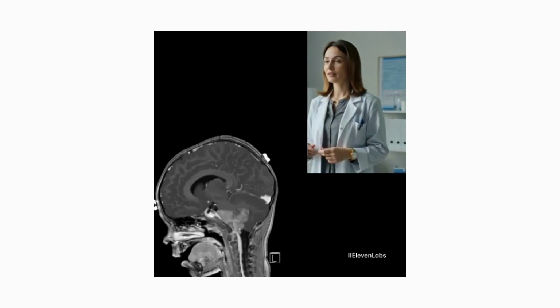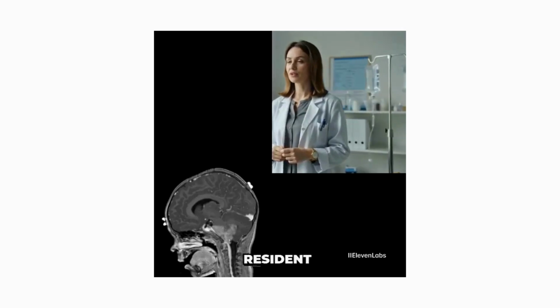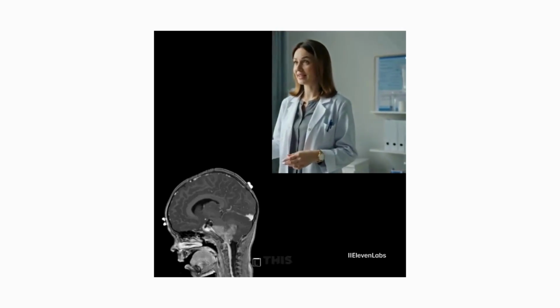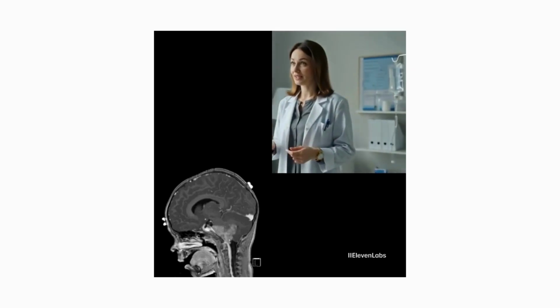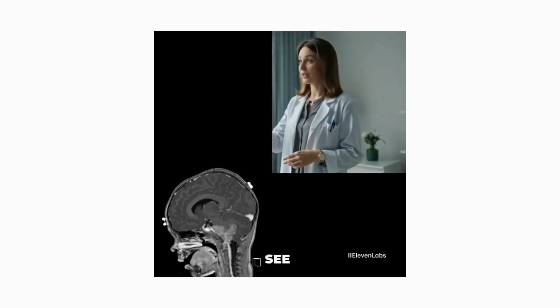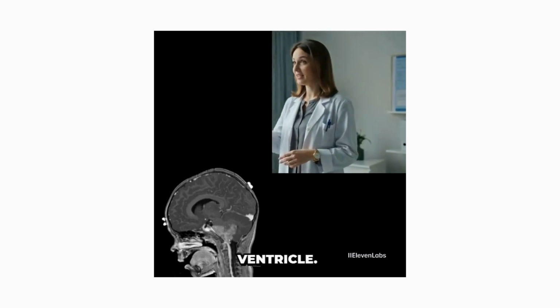Welcome back. Today, we have a diagnostic challenge that every radiology resident must master. Look at this 6-year-old child presenting with ataxia and signs of increased intracranial pressure. We see a large, heterogeneously enhancing mass centered in the fourth ventricle.